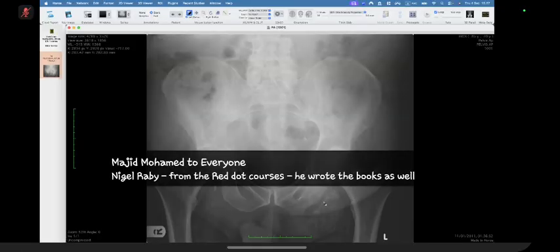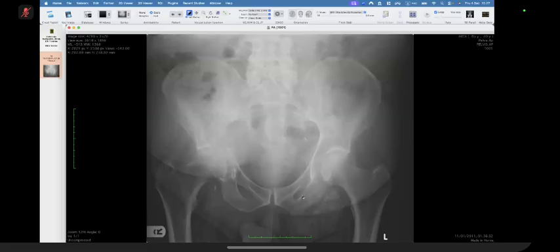Second thing was you mentioned a displaced avulsion fracture. It can't be an avulsion fracture of the iliac bone if the iliac bone is still there. Avulsion fracture means a bone fragment has sheared off. If there's a big giant bone fragment there, this is myositis ossificans. You're not going to do anything about myositis ossificans. You're not going to do a CT. You're not going to do an MR. You're just going to tell the clinician, red herring, mate, myositis ossificans. If you want to take it out, take it out. If you think it's symptomatic, it doesn't need any further imaging.